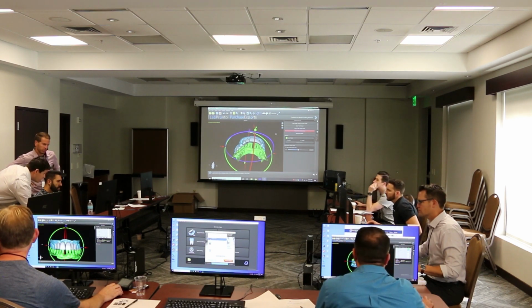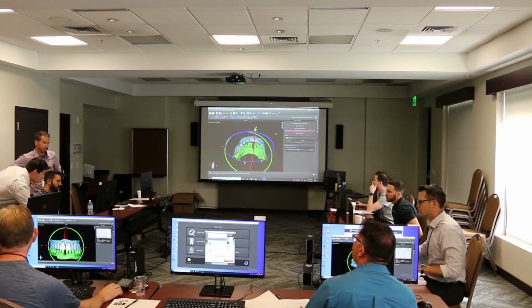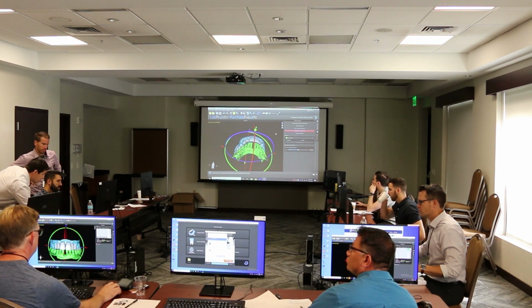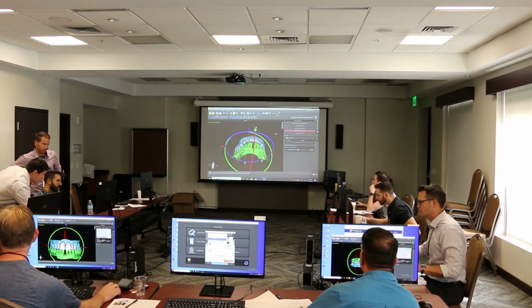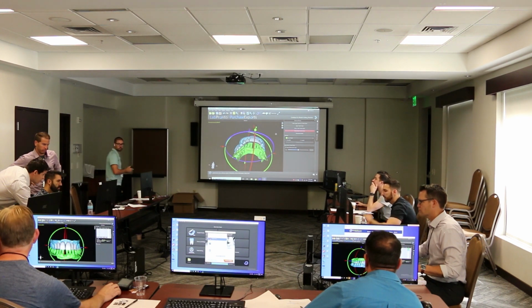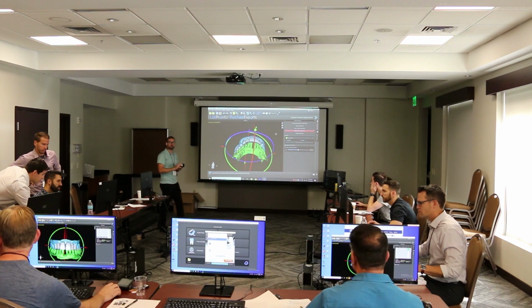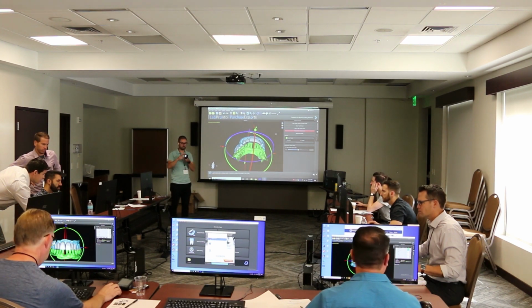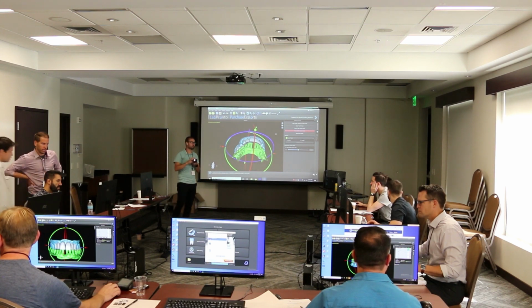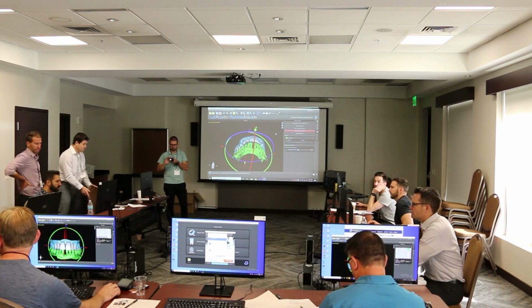If you're not on anything, I see, you can move it like this and look at it from underneath. And say, oh, okay, now I need the green ring and level out this way, right? Okay. And I gotta ring this over like it, right? Okay. And then down this way. Okay. Just kind of mess with it.